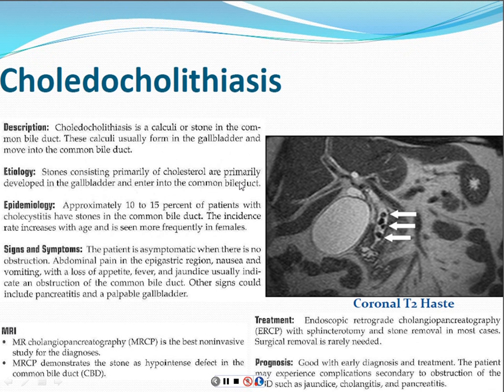This is a bit more common than the choledochal cyst. This is choledochal lithiasis. A lot of patients have gallstones in their gallbladder. Sometimes they won't cause any problem, but sometimes, of course, this is the gallbladder here, they get stuck in the gallbladder neck or the cystic duct, and then once that obstructs, the patient would develop acute cholecystitis. Or if they make it out of the gallbladder neck and cystic duct and into the common bile duct, they could get lodged here.